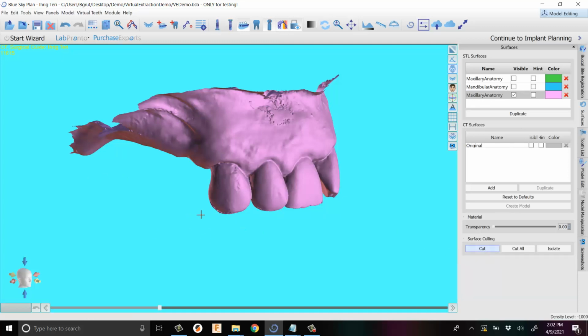Okay? So now my crosshair has turned into a crosshair as opposed to a pointer. Sorry. So now all I have to do is click and sort of lasso around the area that I want to delete. Okay, it can be a little bit tricky. You notice that right in there, I wasn't trying to do a little S-curve there, but I did. And that's one of the things that's a problem with this. When you're done with this, you can hit the escape button or uncheck it right here by clicking on it again.